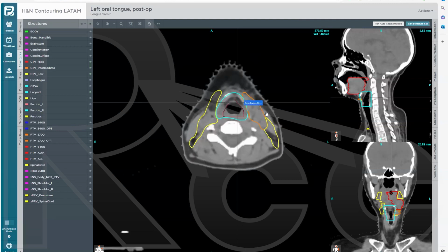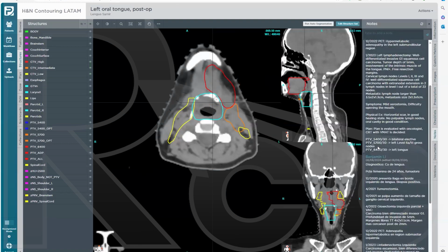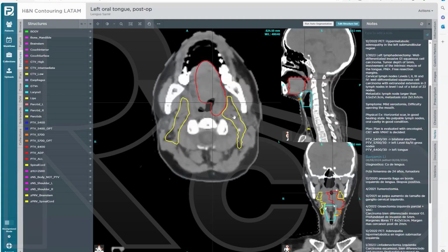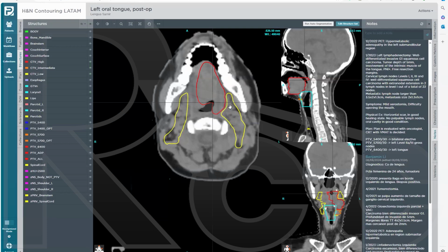Yes. So that's great. Another thing is, now we talked about, let's go back to these notes. PTV, they wanted the 5,700 centigray dose volume to cover levels 2A and 3, right? Which is the orange CTV. So I know this is not, you already had level 2, right? The lecture? Yeah, you had level 2. Yes, Dr. Patel, we already have that. Yep. So level 2, we remember, starts at the caudal edge of the transverse process of C1, right? Like right here. So this orange volume should be starting here. And we wouldn't be drawing the parapharyngeal space, but it would be something like this.